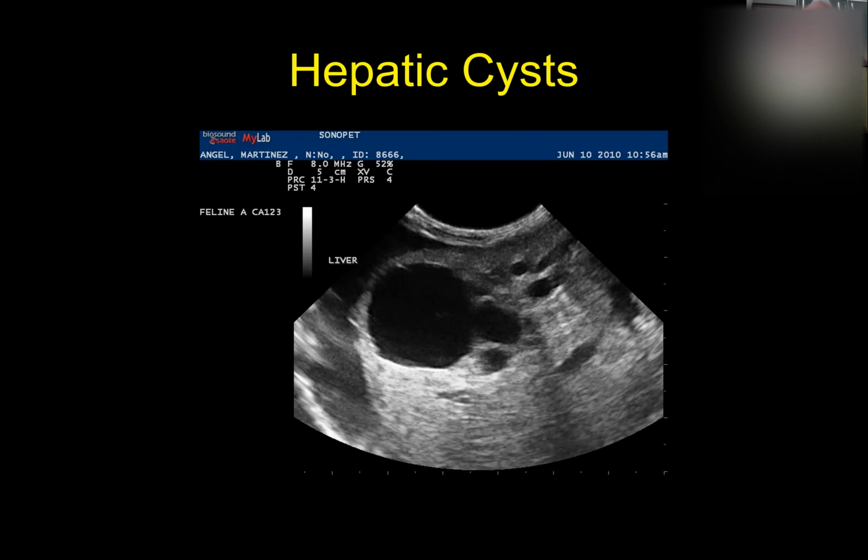Okay. A cyst is defined as something that is filled with anechoic fluid. An abscess, on the other hand, is filled with flocculent mixed echogenic debris inside that fluid. Okay. And the cyst, in almost every case, will demonstrate posterior enhancement artifact. An abscess rarely will, unless it's really early on and the fluid inside the abscess is really fluidy or non-viscous.